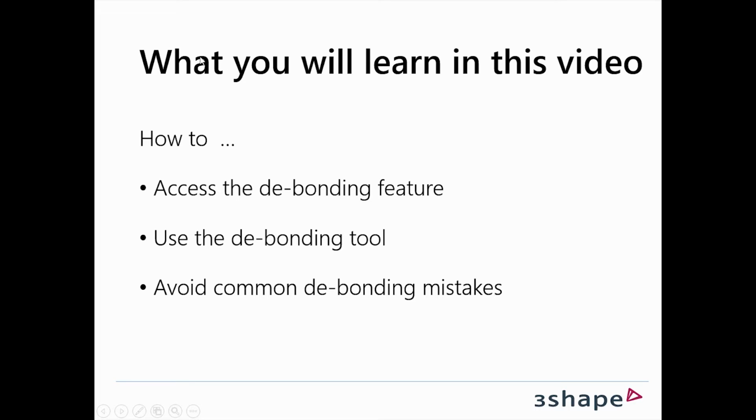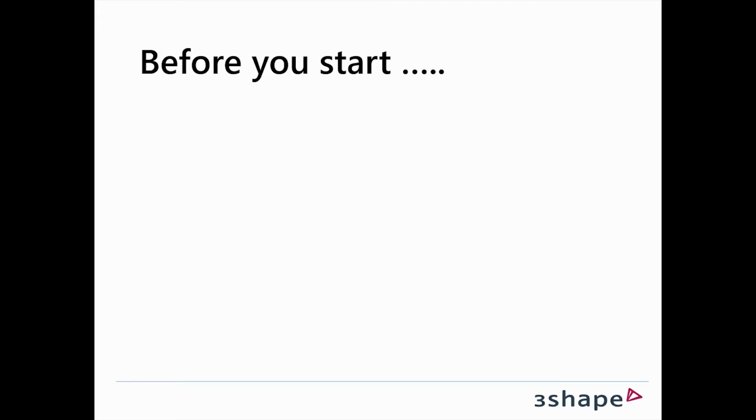So what you'll learn in this video is how to access the debonding feature, how to use the debonding tool, and how to avoid common debonding mistakes. But before you start, there's a couple of things you need to be aware of.